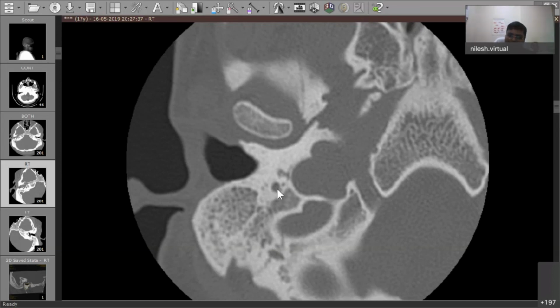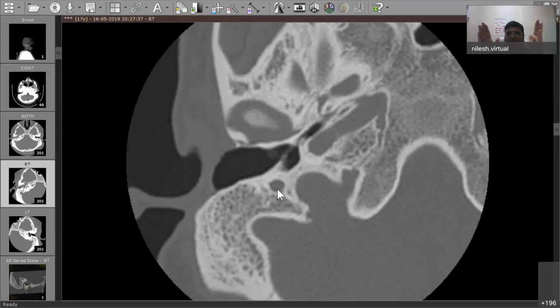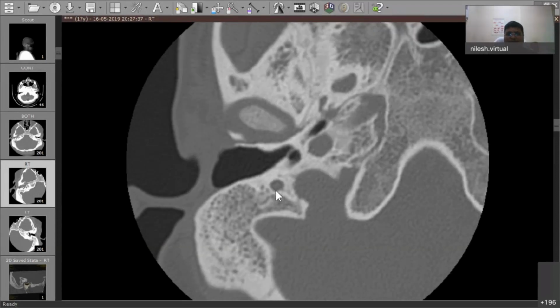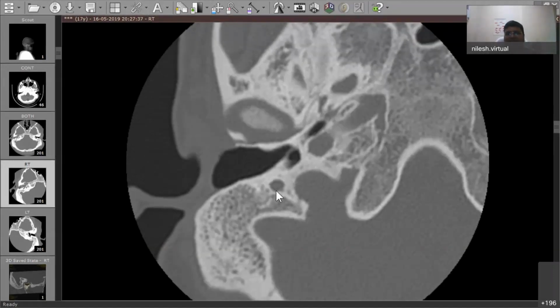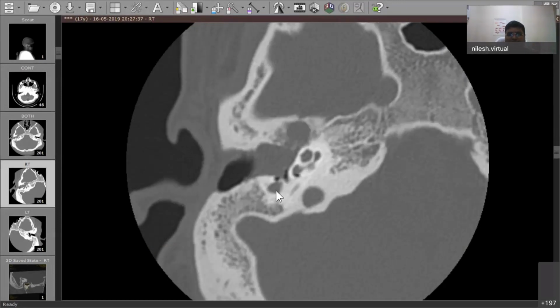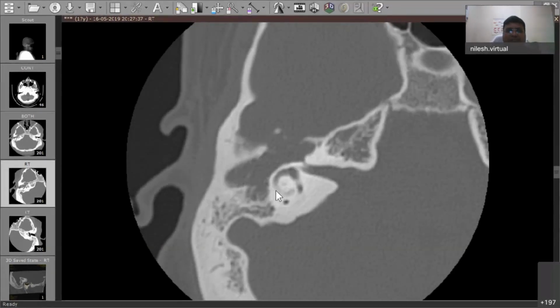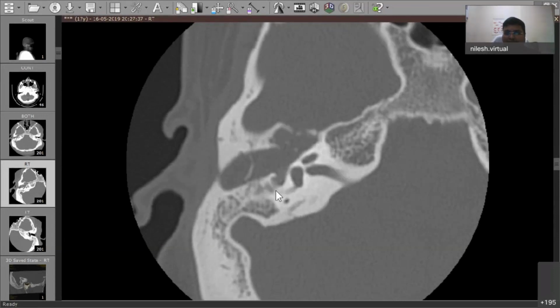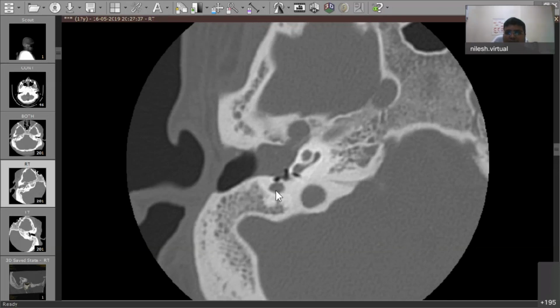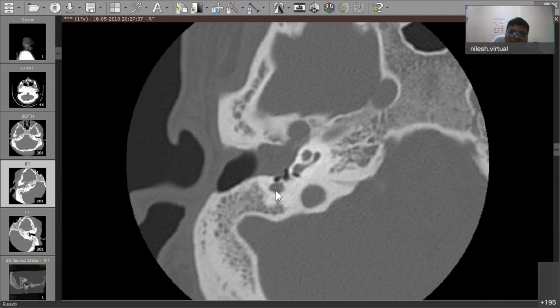Once you go to the stylomastoid foramen, trace it up. Now see here what is happening. Even this is also dilating. At the stylomastoid foramen it was okay, but when you are coming to the mid vertical segment and proximal, it is again dilating. So this is classical of facial nerve schwannoma, where the facial nerve will be affected at multiple places, also called skip lesions. So it may be affected in the parotid also. So in the contrast scan, when you get the MRI done, you have to be careful about parotid lesions also, because facial nerve schwannomas are known to give skip lesions.